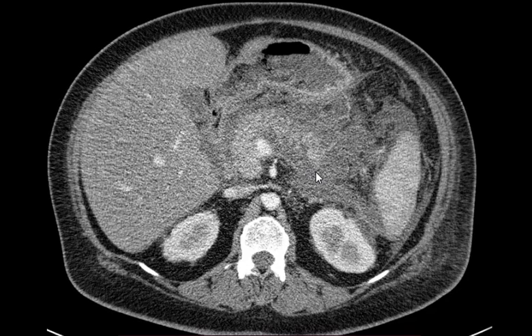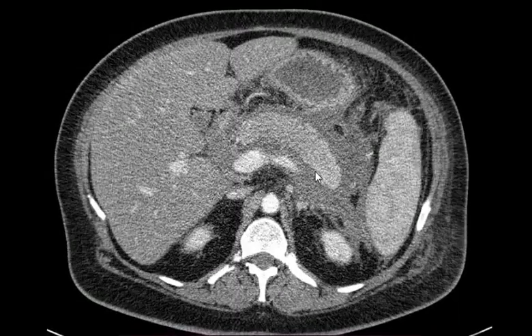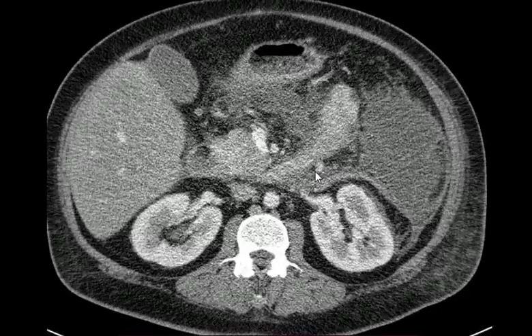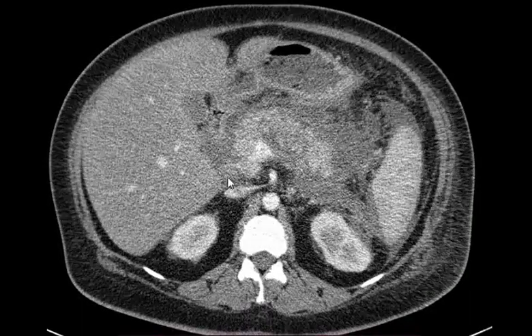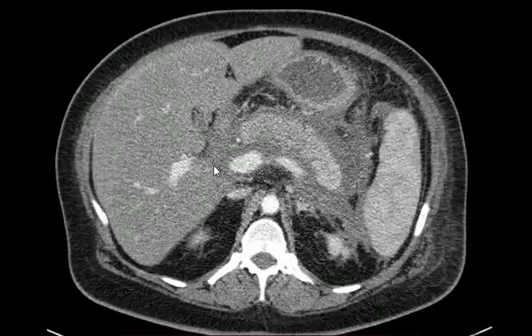Heterogeneous enhancement. Okay. There's no enhancement defect in the pancreas, marked. What do you mean no enhancement defect? Sometimes there's ischemia or it may be related to a mass, a clear, well-defined mass. Not definite masses, let's say.